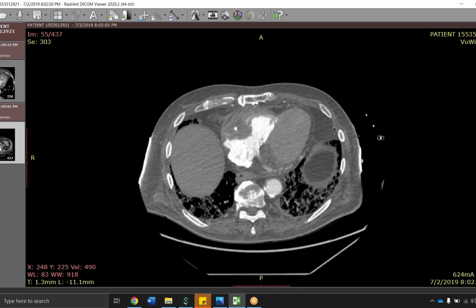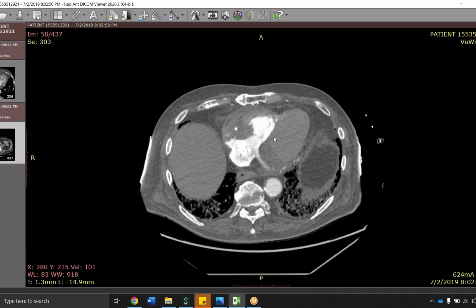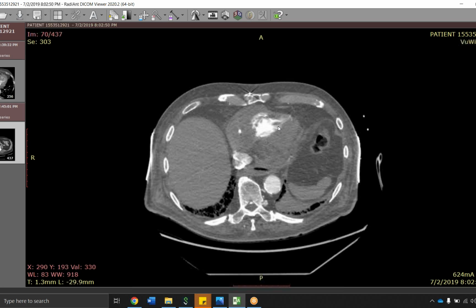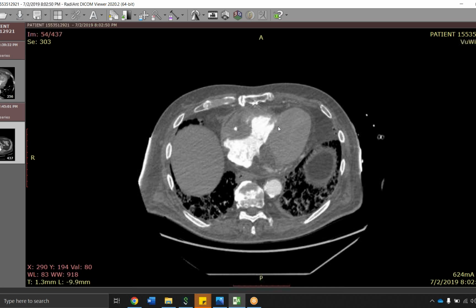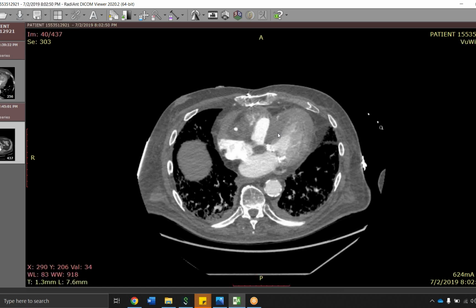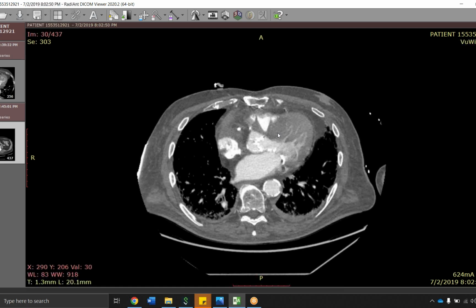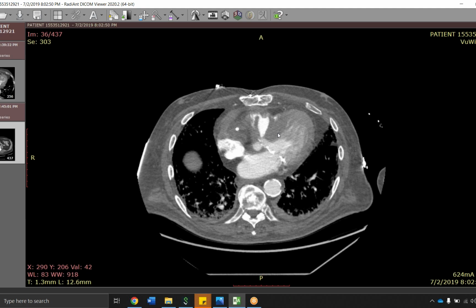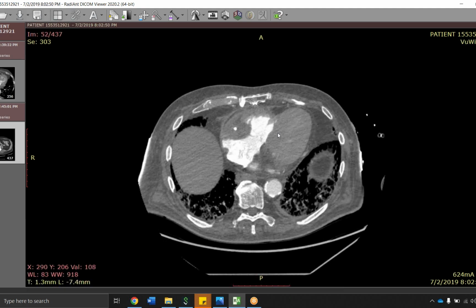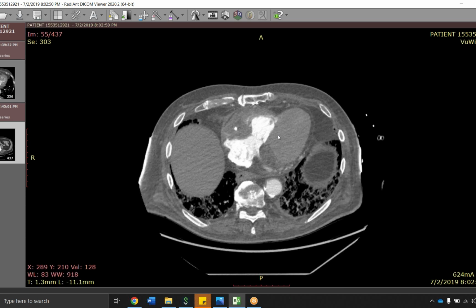Yeah, this is epicardial hematoma associated with revascularization. It's not common. It's not really normal. I've seen it worse than this. And if you asked the surgeons and had a gross picture of it, you would literally see what looked like a big blue tube, because it looks tubular, along the pericardium.